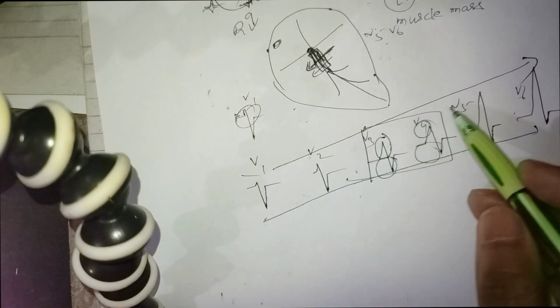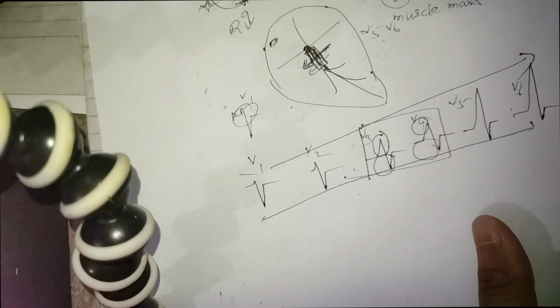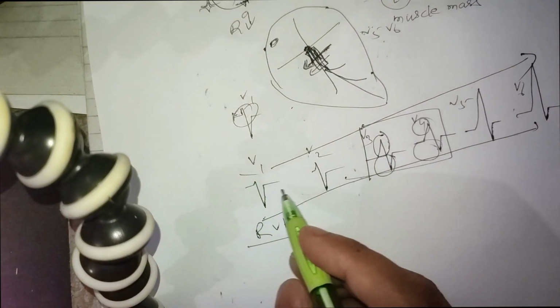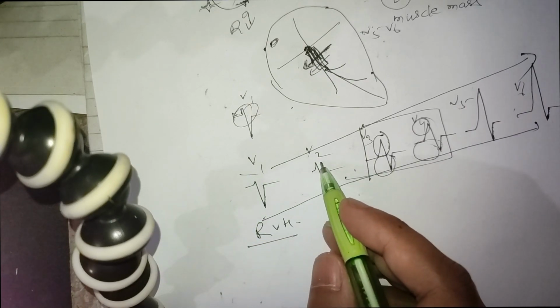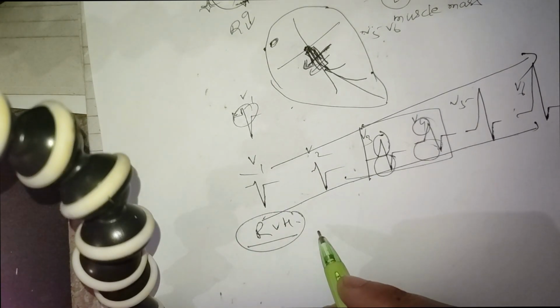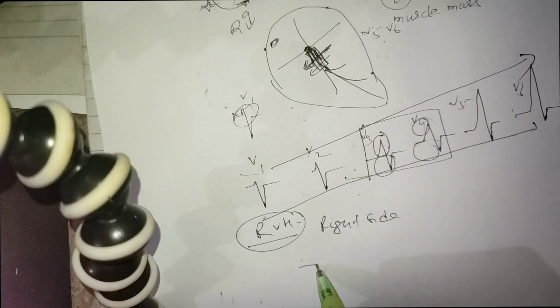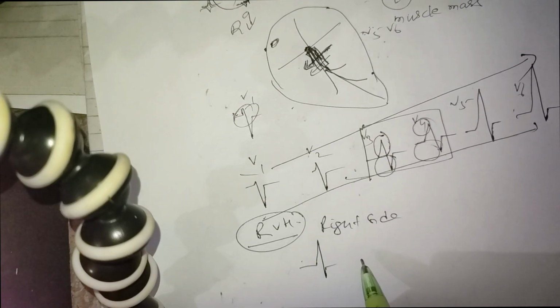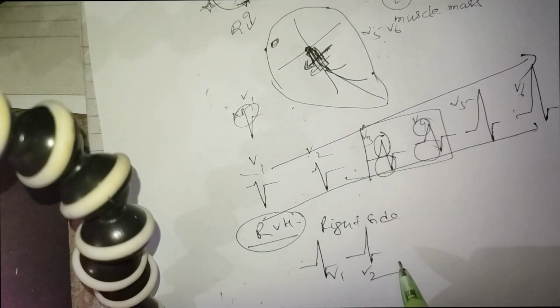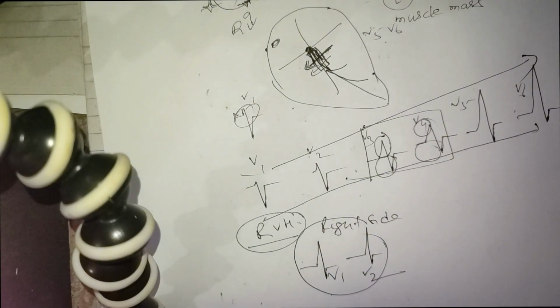You look whether the R wave is progressively increasing in voltage or not. If it is not, then it can be pathological. In right ventricular hypertrophy there is a bigger R wave in V1, V2. These are right precordial leads, and if there is hypertrophy, there is more muscle mass on the right side, right ventricle, so you will see a big R wave and a small S wave. If you see a picture like this in V1, V2, it is abnormal, it suggests right ventricular hypertrophy.